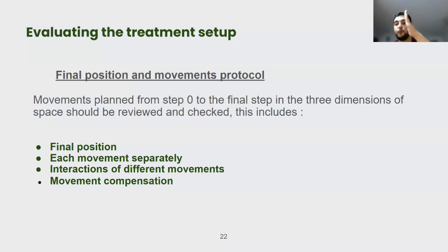It's always going to tip while moving. So to make sure that it does not tip, I overcompensate in the treatment setup. So instead of it moving in a bodily fashion in the treatment setup, I want to add some tipping in the opposite direction so I can compensate or overcorrect the side effect that I'm expecting.